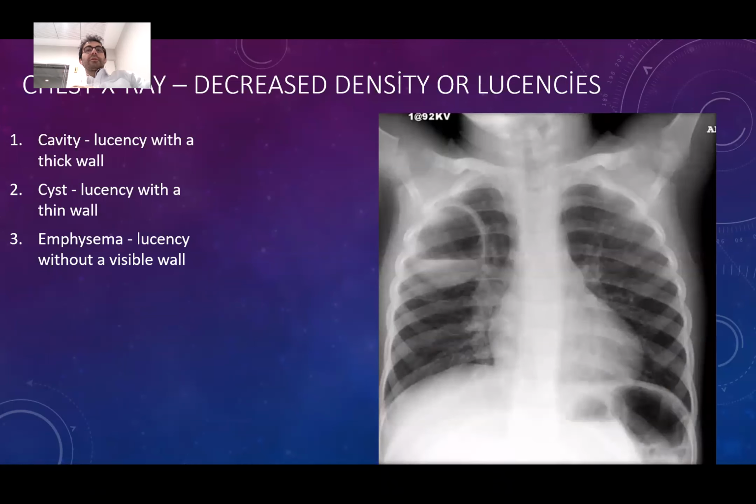Also, when you're seeing something like this with a fluid level, what should we be thinking about? We should be thinking about abscess. Okay, this looks like an abscess. It's a very big source of infection. Probably something congenital. It's a child which is infected.